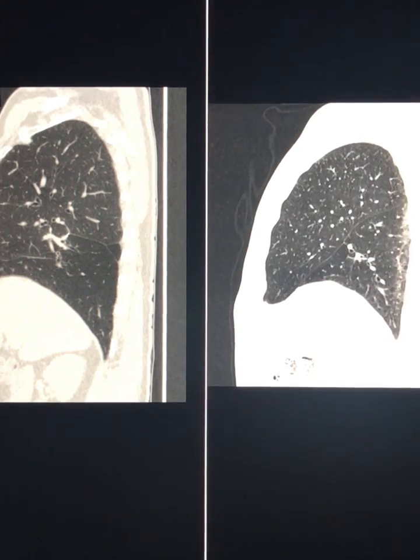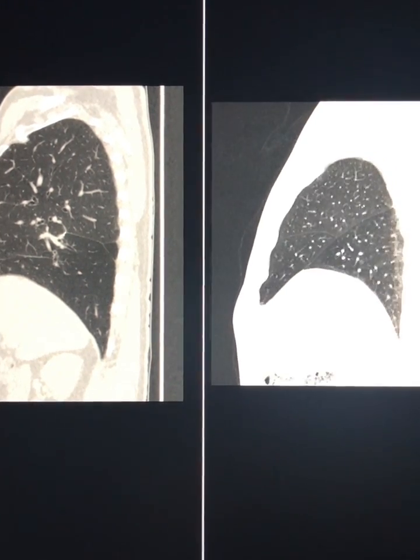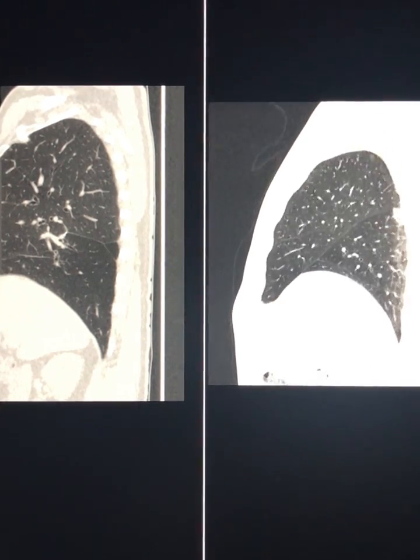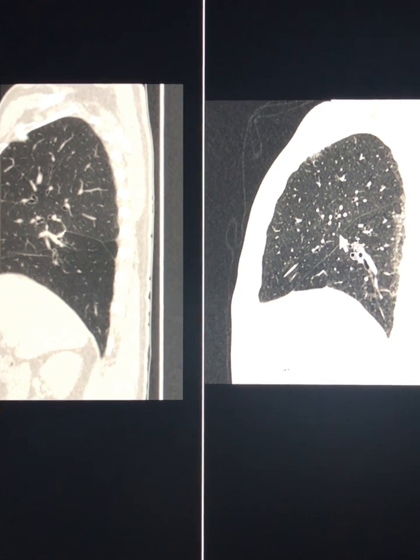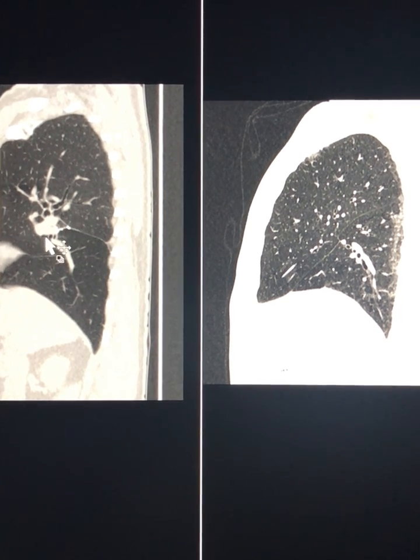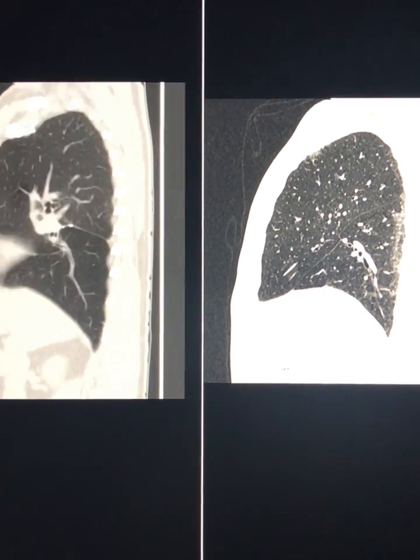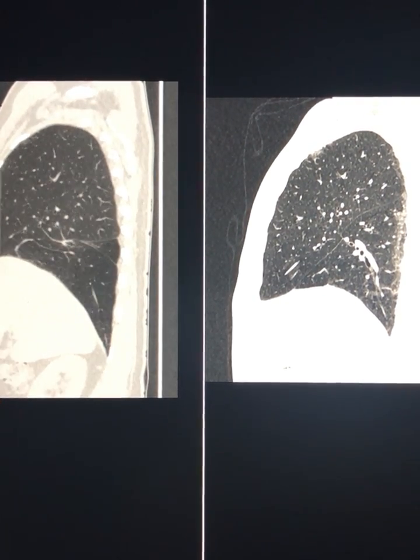In fact, when this lobe gets removed, whatever is left of the horizontal fissure gets distorted considerably, and this fissure here, which used to be the demarcation between the middle lobe and the right lower lobe, can rotate and now occupies this position here. So the orientation of the bronchi can be extremely useful in assessing a post-operative situation, especially if the surgical history is not very clear.